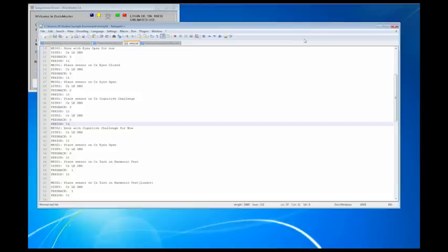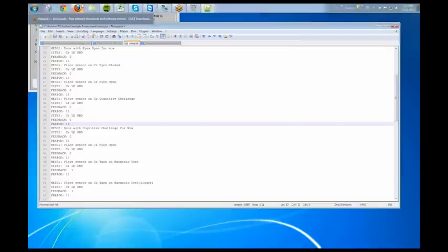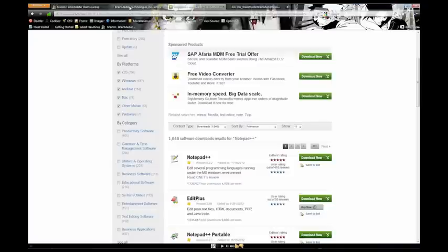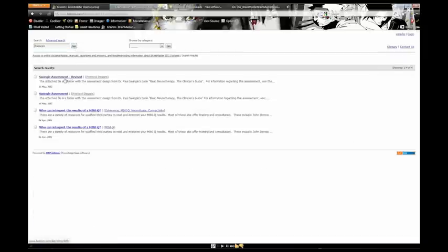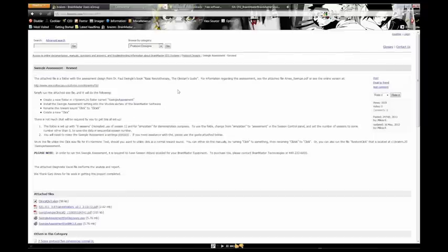Beth, if you use the Swingle assessment installer that is located on our knowledge base, let's get in here. I'll go right here and do a search for Swingle, Swingle assessment revised. This gives you all the instructions on how to turn on harmonic sound. Basically, it converts one of our wave files into a harmonic sound, and it holds it for the time that you need it to be held for.